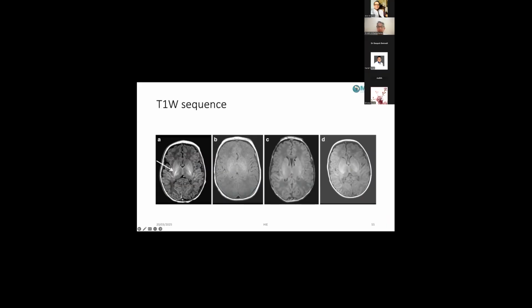This is again another baby. So this is quite an extensive one. And the B image, quite an extensive swelling, inflammation. You can see the ventricles are barely there, squished, midline shift. You cannot make out any gyral and sulcal markings except for these lateral areas. So quite an extensive cerebral edema here.